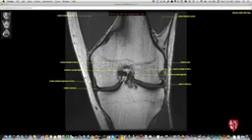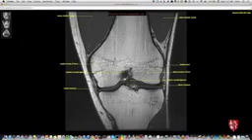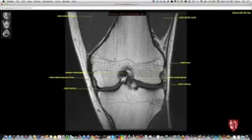If I just leave this on the coronals for a minute, I won't go through all the labeling, but my approach has typically been to go through the coronal scans systematically, and then I move to the sagittal scans and then the axial scans to finish up. The rationale is that I don't like to be jumping around between different series.